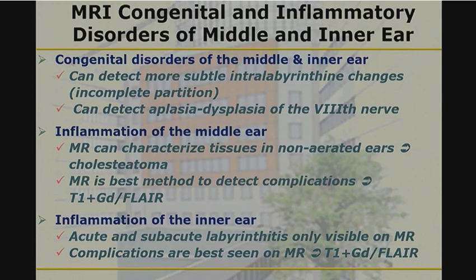How come we don't have an issue between not being able to distinguish an abscess in the temporal bone from a recurrent cholesteatoma? Would that also be brighter on DWI? Exactly. I'm glad you asked the question. There are two booby traps, and the two booby traps are abscess and cerumen in the ear. But they are both easy to find.